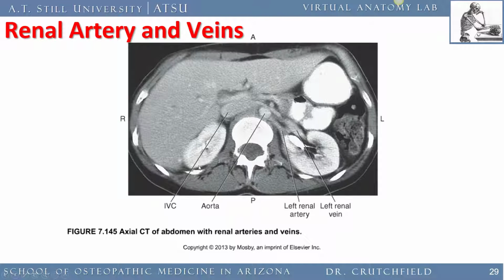So let's take a look here in the anatomy that we've seen a million times. So here's left kidney, right kidney. This is the inferior vena cava and the aorta. And we know that the renal vein, the left renal vein, crosses over the aorta. So here's the left renal vein crossing over the aorta, draining into the inferior vena cava. This has contrast in the collecting system of the left kidney and contrast in the collecting system of the right kidney. This is stomach. Here is descending colon. Of course, this is liver.